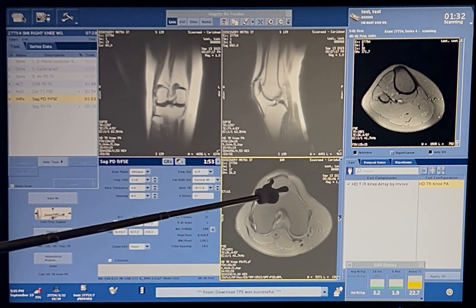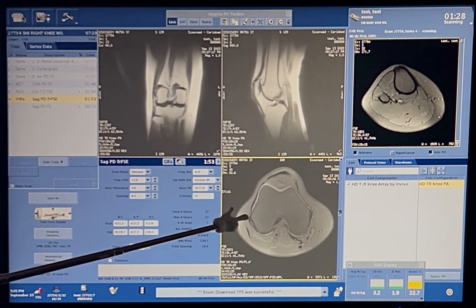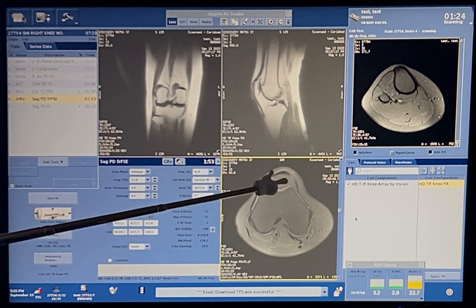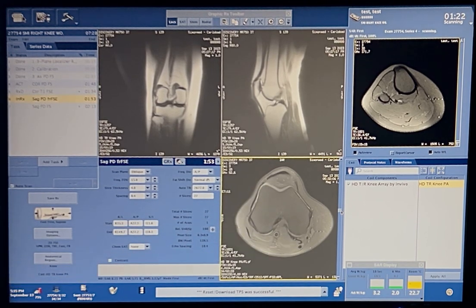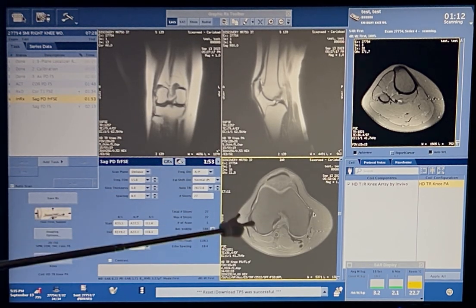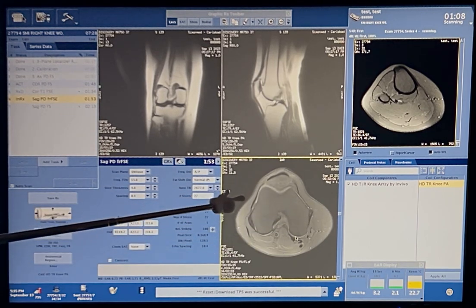See how this side's a lot more rounded, and if you scroll up too, this side forms that L shape. Mm-hmm. It's almost L for lateral, whereas this side's a little bit more rounded typically. Okay. So you can always tell what's what based on that. Okay. Lateral and medial. Yeah, rounded medial, L for lateral. I know they both kind of form an L, but this one's a lot more rounded than this one. Okay.